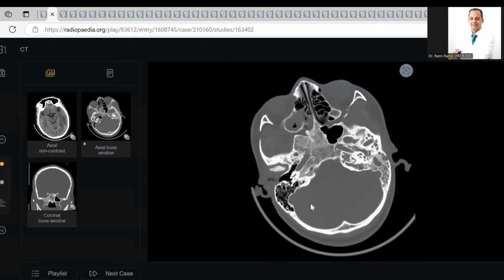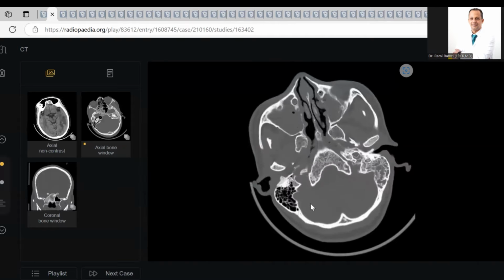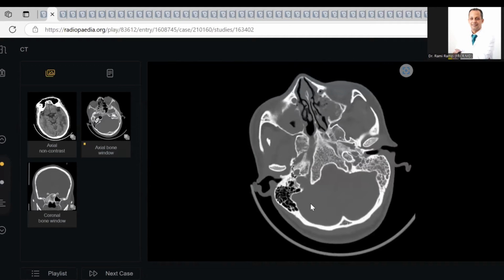What else? I will also look at the venous sinuses, and there is no evidence of hydrocephalus in this patient. There is maxillary sinus opacification. This could suggest maxillary sinusitis in this patient. What is your next step? I will immediately convey my findings to the referring physician and refer this patient to the neurology MDT.